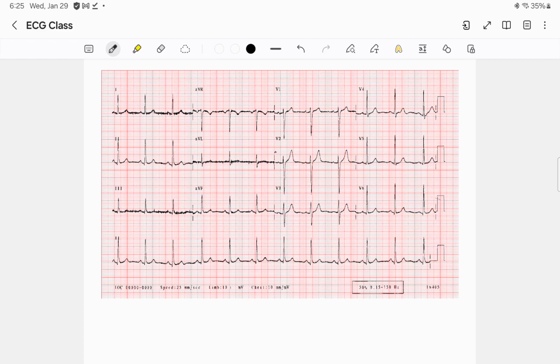so it will show the electrical activity of the heart in a particular lead over a 10-second period. So therefore, if you count the impulses or the QRS complexes, right? Because remember, QRS complexes correspond with the ventricular contraction. So if you count the QRS complexes over the period of the 10 seconds, you can thereafter multiply by 6 to get the heart rate, which you would get in a full 60 seconds, right?